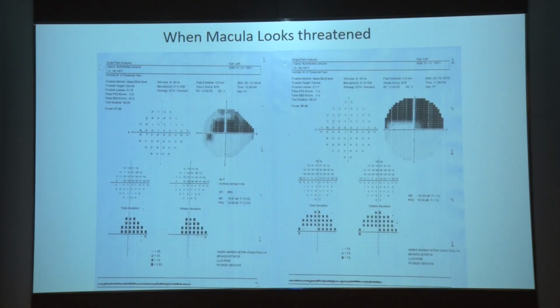Now here, in a field like this, when the macula is threatened, what do we do? Very important. Kirti is to operate on a patient, 24-2 is done. Now she is worried about whether I should do a trab or not. I think I'll finish with this because the time is over, right? So now tell me what is there. She knows everything, but still she's not comfortable, this macula is threatened.